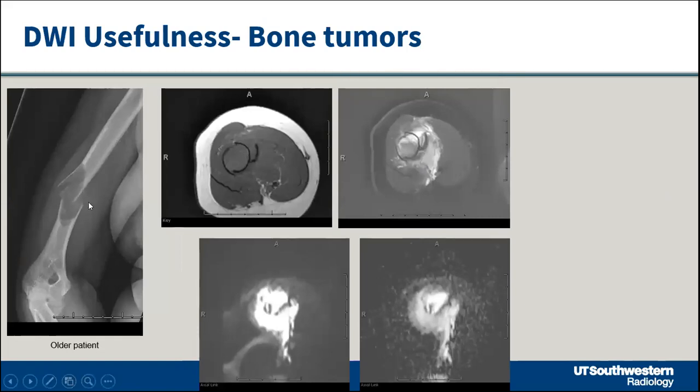Now, the problem comes when you have a lesion like this. Again, quite sharply defined, doesn't have sclerosis, but sharply defined. And if you look here, it's a hemorrhagic lesion. It has that bone fragment through it. So is it the trapdoor sign? You look for the fallen fragment sign, you look for the trapdoor sign. Is it the trapdoor sign, or is something else happening?